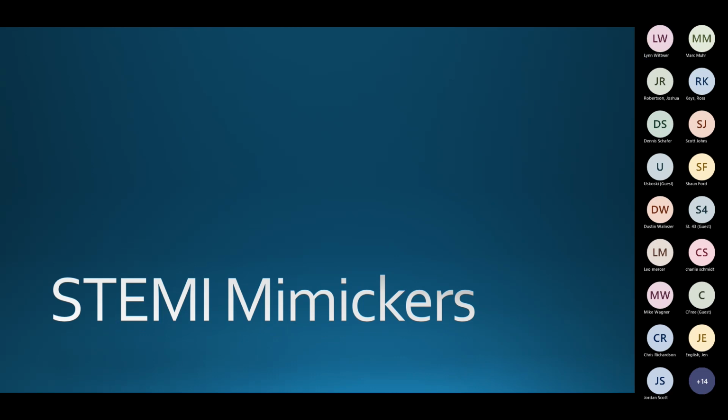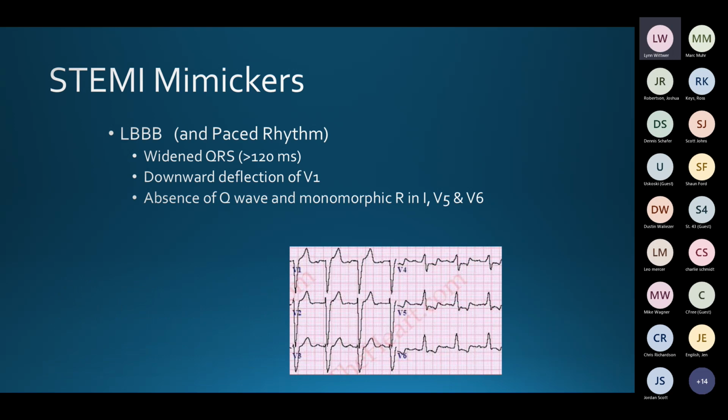So I've rearranged STEMI mimickers to the ones that count, in other words, the ones that are the most common. The most common of our STEMI mimickers is left bundle branch block, and also paced rhythm. For both, the same thing applies.